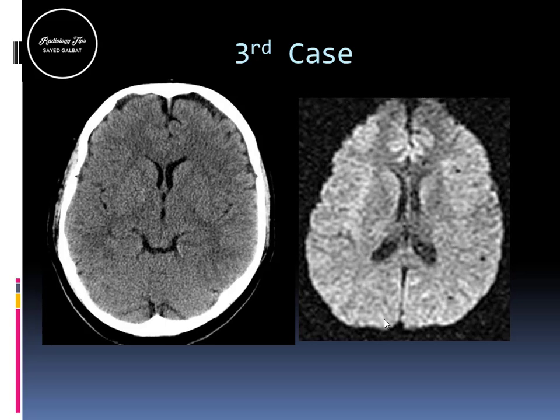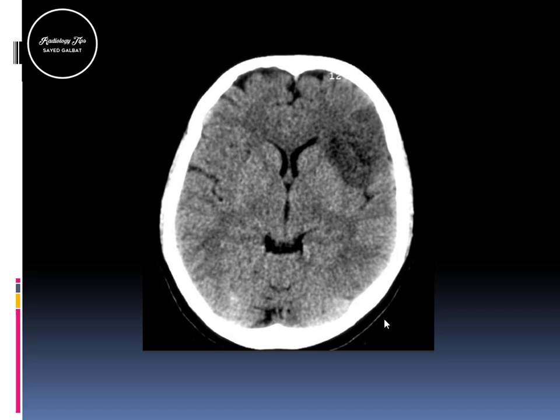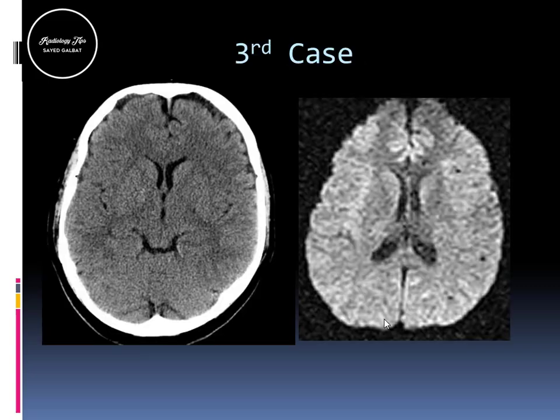Okay, but again, you have to see something in the brain because the patient is still complaining and symptoms are progressing. Okay, CT angio, maybe it's helpful. Anyway, this patient did a delayed post-contrast study. Okay, before the delay, this is the previous study of the patient, and already you can see there's an abnormality here, and it's most likely an infarction, right? So why is it not there in the second scan?